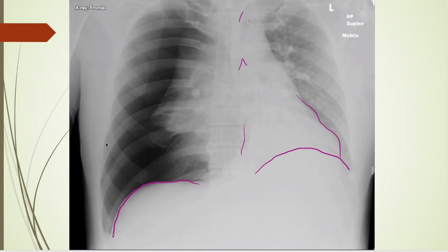And you can see this sulcus is really deep again as well, so that's a clue. But you go on to everything else. We'll go ahead and look on the left side here. Good lung markings. Low volume, though. Look at the patient's right side, and you see no vascular lung markings at all over here. Just none. And this here, so obviously has a pneumothorax.